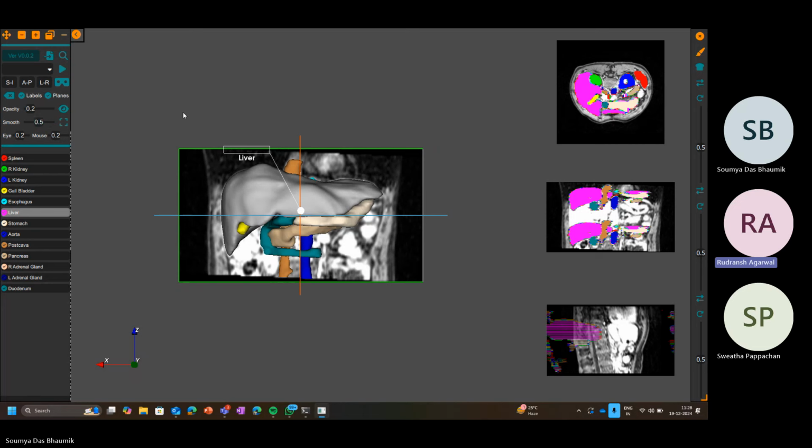That is not something that is of interest to the kind of audience we present to. This is a parameter that we set while making these meshes. And the eye is not for this 2D view, the eye is for the 3D view. See the glasses there, to the right of the left and right. Yeah, this one.